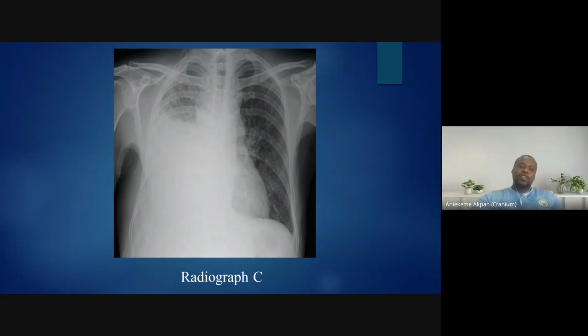But if we are talking about pneumothorax, that is air, and we said that air is radiolucent, or air is dark. So if you have air within the pleural cavity, it will not be white, it will be dark. And imagine that the air in the pleural space is black, and the air within the remaining lungs, at least the small lung portion that is remaining, is also dark.